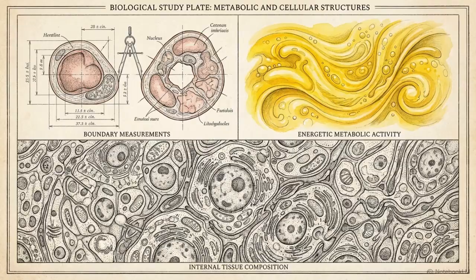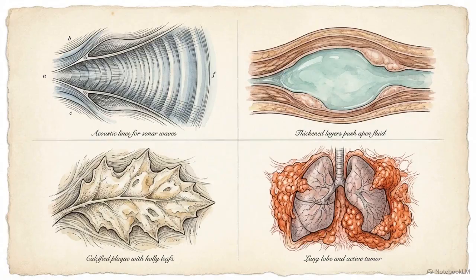When tissue expands the pleura, contrast CT defines the boundaries, but PET and MRI quantify the metabolic activity and internal tissue composition of the tumor. Pleural pathologies are diverse, and no single modality can solve every diagnostic challenge.